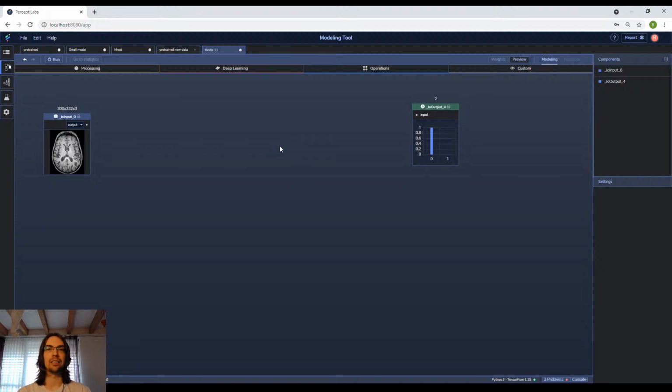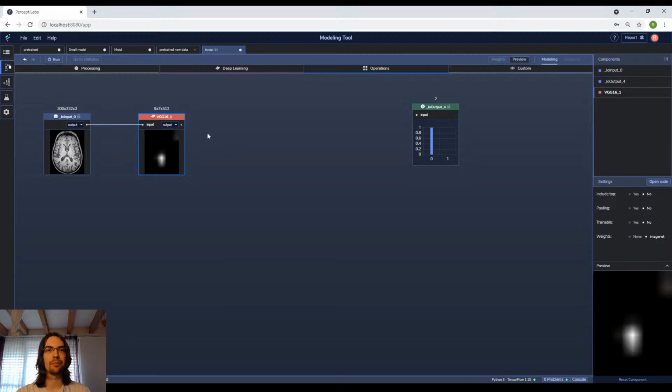And then finally it has 3 dense layers at the end of it as the output. Since we're using a pre-trained layer and we're removing the top part of the model, we don't include the top over here. Those 3 dense layers are not going to be included, and the output we're going to see will instead be something like this. So we're getting the output of the last pooling layer in this VGG model.